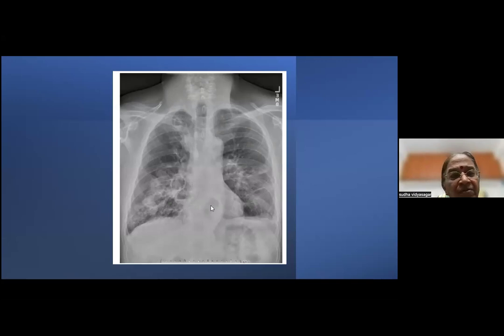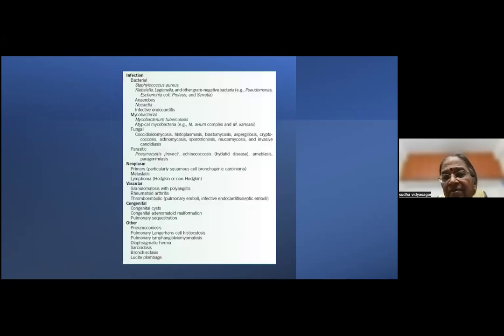What are these? Okay. Fibrosis, cavitation, okay, and multiple small cavities are there, etc. Okay. So they're all looking like multiple small cavities, bronchiectasis, need not be lung abscess. They may be just cystic bronchiectasis which are sitting there. Okay. So these are all the causes of cavities in the lung.